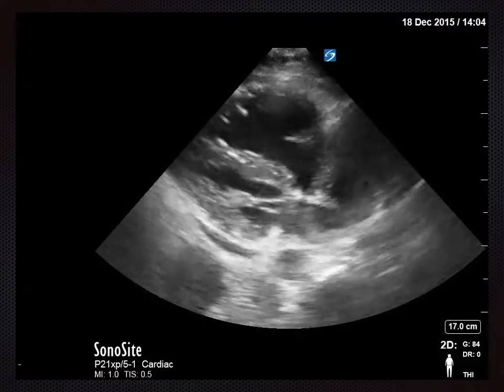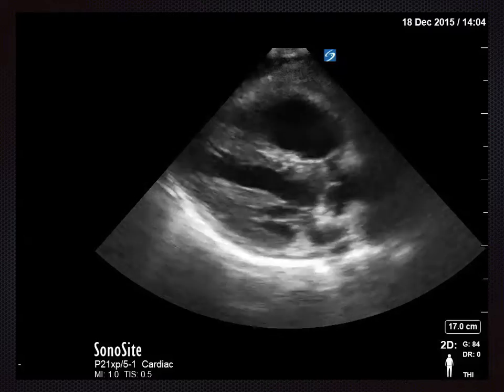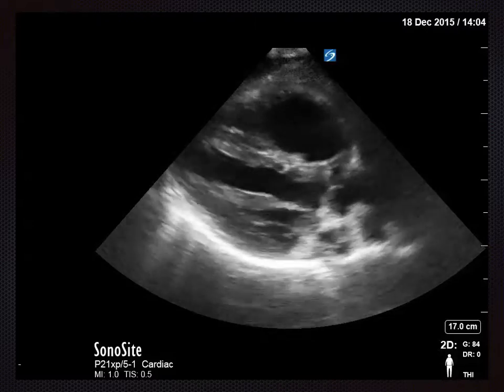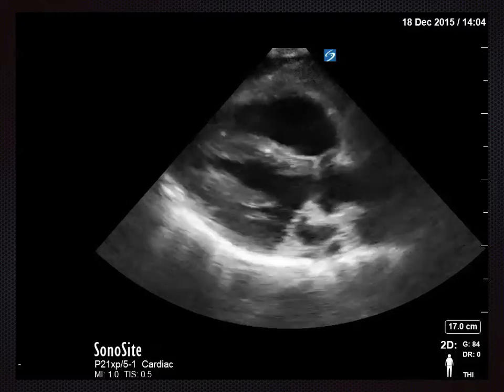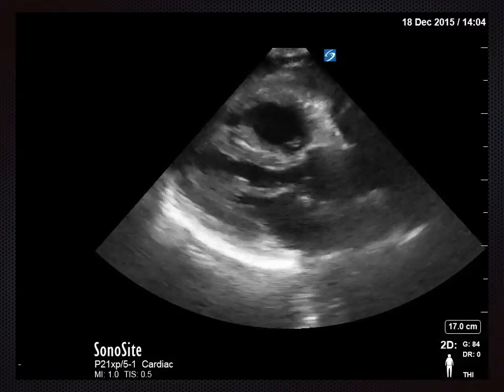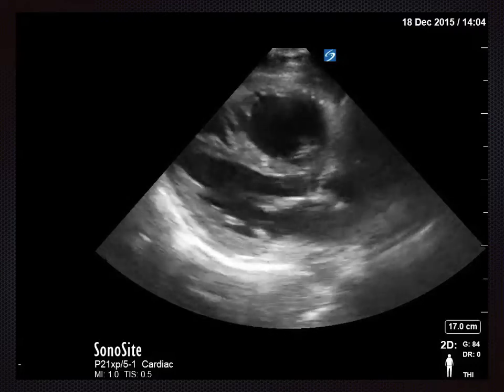But you have to be warned that sometimes if there is a pericardial effusion that is an exudate or an infection or old clotted blood, it may also have the same appearance. So we don't want you to necessarily be able to identify the cause, but whether or not you think this fluid is good enough.